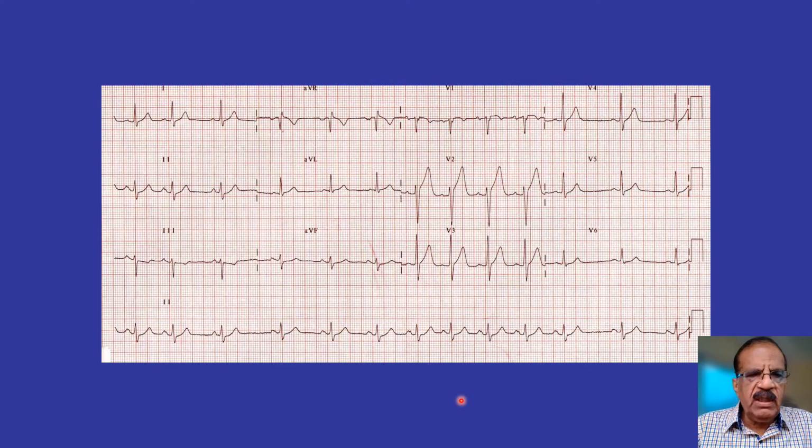What do you see here? This is again the same tachycardia, bradycardia, tachycardia, bradycardia. This is again sinus arrhythmia. You can confirm the variation more than 10%. So this was about sinus arrhythmias. Now we will take up some other abnormalities of SA node.